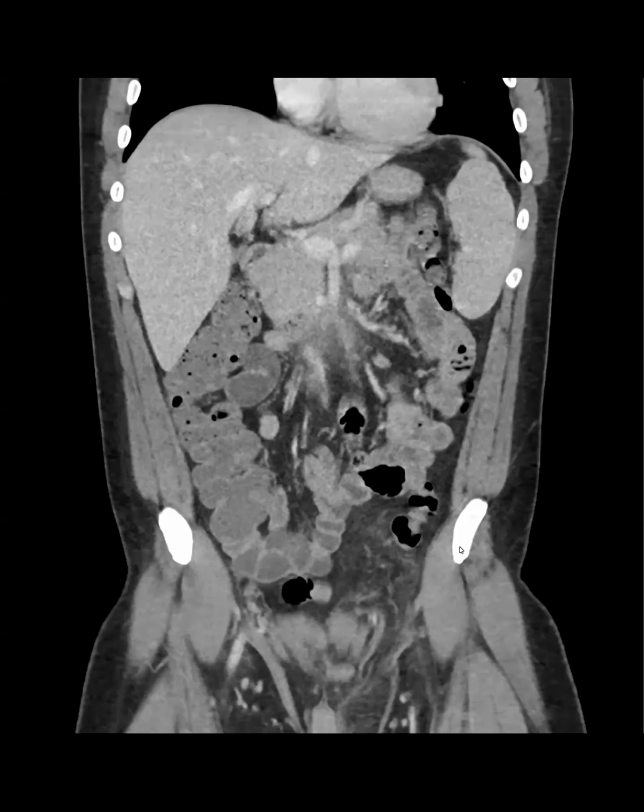But it does, like you said, look atypical for MCN. It looked atypical for IPMN. So I'm kind of not surprised it's something weird. And I showed one recently that I thought was an IPMN and turned out to be a cystic neuroendocrine tumor. So that was another one that we can think about too.